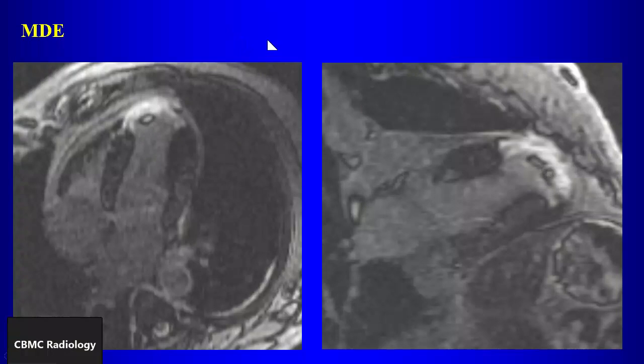All right, so again, we have, sorry, nobody pays the point. So what would you do to prove that it's thrombus then? What is the next step? Increase the inversion recovery time to 600.